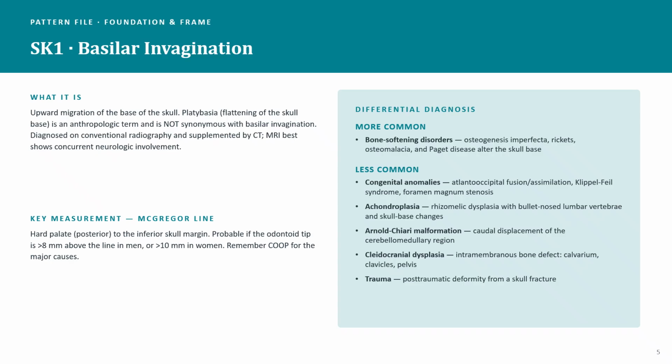On a man or a woman, there's a specific measurement. So with this, again, that means that the skull base has flattened out and the odontoid is actually sticking up higher. This is typically going to be diagnosed on just a regular bone image, skull image. The patient could potentially have additional imaging with CT or MRI.